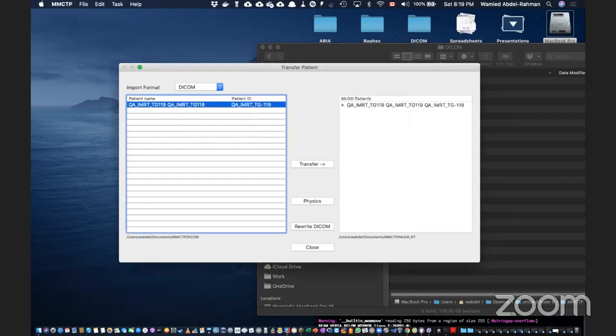So now, if you have EGS and MCTP in the same machine, because we have to define the shells, I think you will probably still need to communicate. So it's going to be an SSH to a local machine, an FTP to a local machine. It's not like defining directories. So I think you will need to just have the SSH. If you don't want communication from outside, just unplug the Ethernet cable from a machine. But probably you will need that because probably you're going to transfer files. So now it is there.